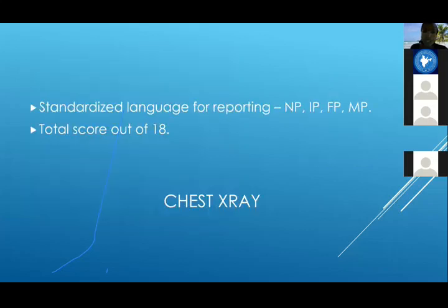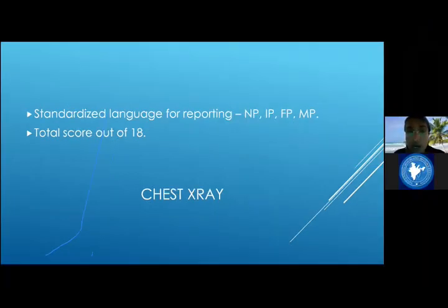So just to conclude the chest X-ray, we should use standardized language, that is, no pneumonia if the lungs are clear or the findings are stable. Indeterminate for pneumonia if we are not seeing consolidation, but we are seeing linear patches. Focal pneumonia, if you're seeing a focal pneumonic patch, and multifocal pneumonia, which is typical, where we are seeing bilateral consolidation. After reporting it as one of these four, we should score it, that is, out of 18, and we can serially follow up the chest X-rays.